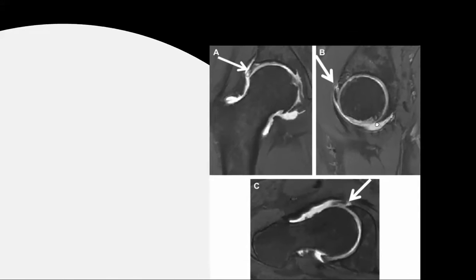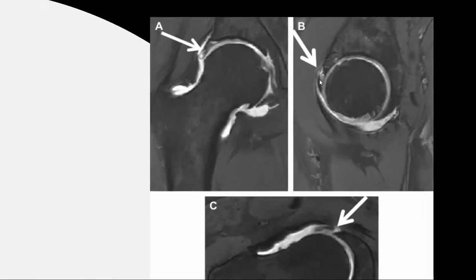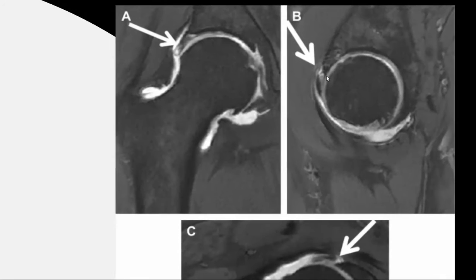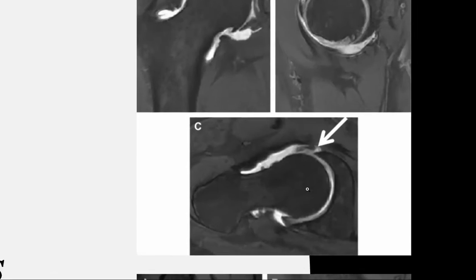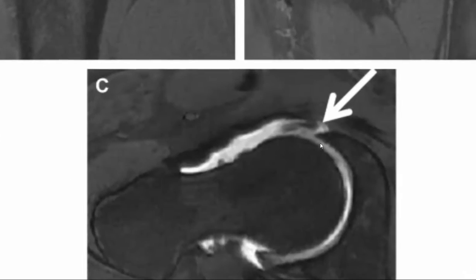You can see here on the sagittal sequence, the labrochondral junction also has got high signal within it. And here on the axial sequence, that sharp triangle is gone, and you've just got this irregular high signal. This is contrast seeping across really a degenerative labrum. It's quite significantly degenerate. It's a complex degenerative tear. This is how we would describe it. The morphology is distorted and abnormal, and this gadolinium signal within the tear.